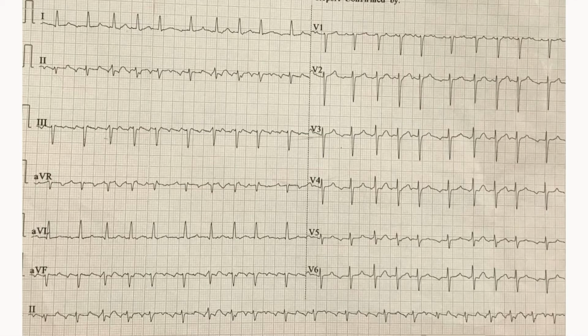Next, if you look closer at this ECG and we find that it is an irregularly irregular rhythm, when we ask beginners in ECG like our interns or first year postgraduates, they give me an answer of atrial fibrillation for this ECG. But is atrial fibrillation right or wrong? It is wrong.